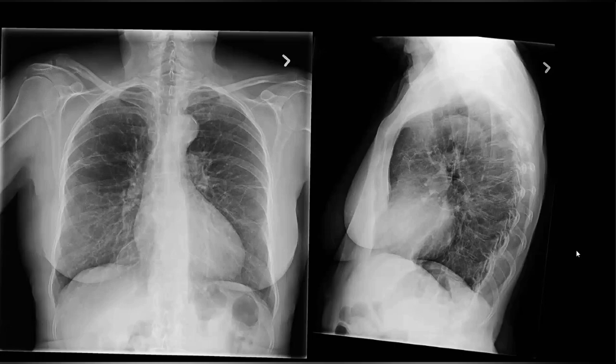Third, it could be a case of lymphocytic interstitial pneumonia, which might also present with multiple cystic changes. What is the zonal predominance for lymphocytic interstitial pneumonia?